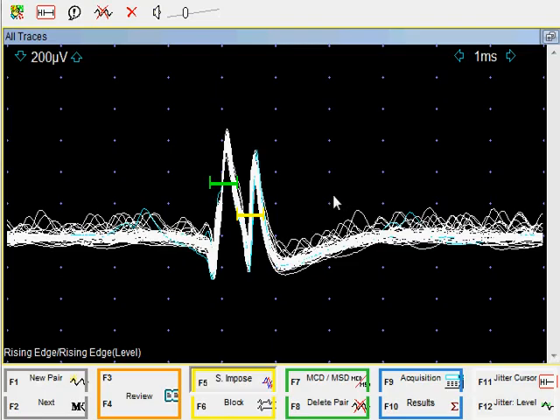And we also have 2 windows that are overlaid. They look like the so-called TIE fighter from the Star Wars movie, or like an H symbol. There are 2 of them, one in green and one in yellow. We call them the start and the stop windows. By default, the start window is placed at the trigger location. So this is where we were triggering the signals. The program automatically places the stop window where it finds a sharp time-locked potential.